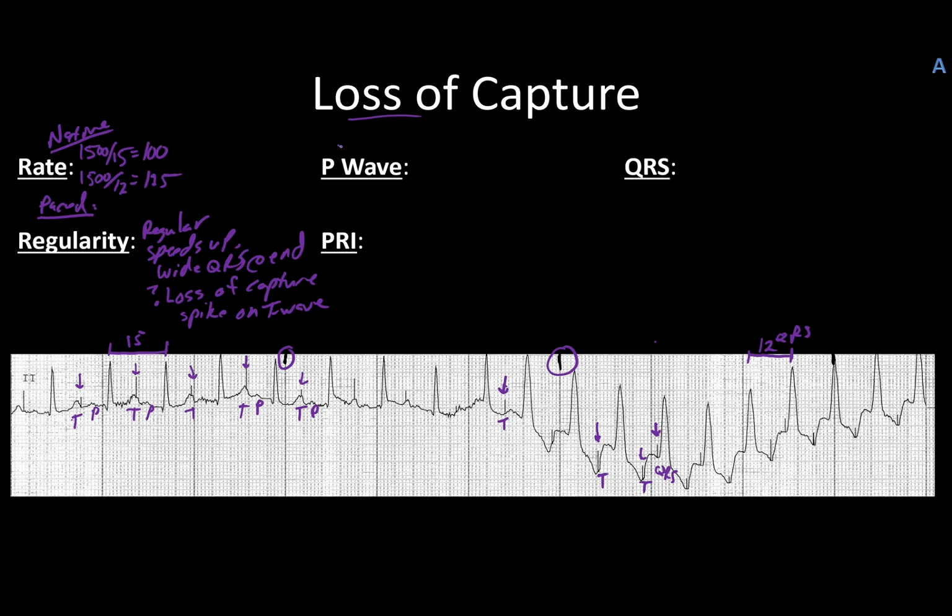So for our native, which is at the start, we actually do have a pretty good look at what's going on. So if I measure from the start here to about right there, gives me 1, 2, 3, 4, 5.